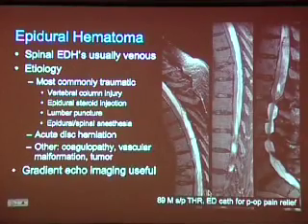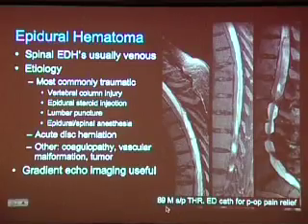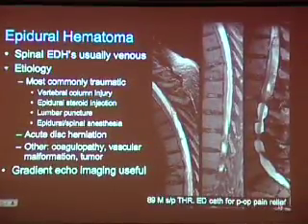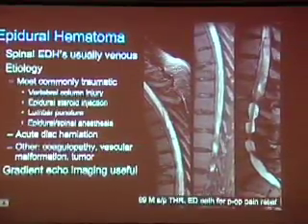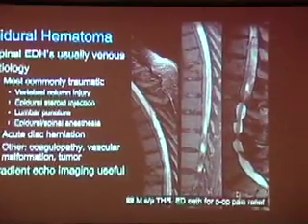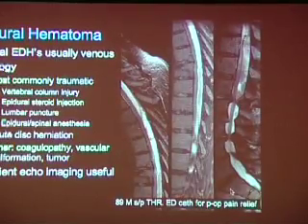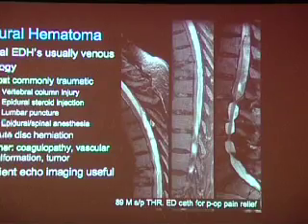And this is just a case that I saw a number of years ago of an 89-year-old gentleman who was status post total hip replacement. And he had an epidural catheter in place for post-op pain relief, and then he was unable to move his legs, and even at the point where they were lightening up and he should have been able to move his legs, he was unable to move his legs. So he was brought down to the MR scanner, and what do we see?